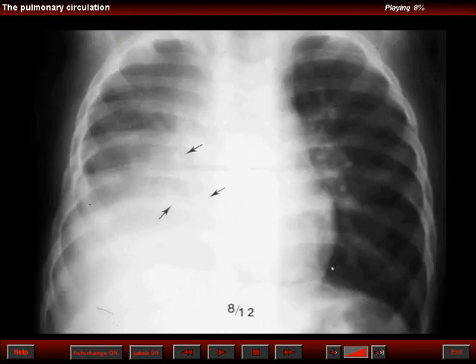In this other view, we can see markings that are directed towards the midline and towards the angle between the diaphragm and the heart. This case may have been considered an example of a hypogenetic or hypoplastic right lung syndrome, the so-called venolobar syndrome or the so-called scimitar syndrome. It was another example of a horseshoe lung.